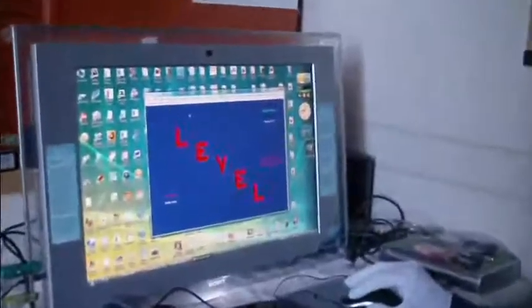We repeat what we did yesterday on this new computer now. We click on Setups, and then Set Internet Data Storage, Use and Don't Use. And as yesterday, we now should make the choice, yes, I do want to use Internet Data Storage, and we click on OK.